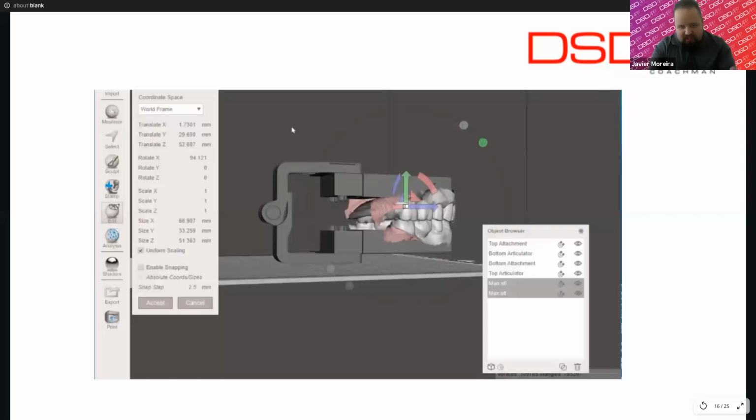When it comes to dentistry and making sure that you have two models that intersect, it's really difficult to figure out your occlusion because there's no friction in 3D. Things will pass through each other without a problem. You'll always run into that problem. So to check your occlusion, you actually need to use this digital tool that you see on the screen right now.